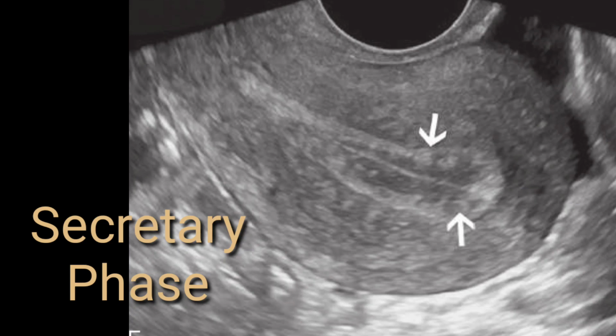So again, this endometrium is in secretory phase, and its thickness is nearly 15 to 16 mm. Many clinicians also suggest that secretory phase can be divided into two: early secretory phase and late secretory phase. Well, it's up to you if you are confident enough to mention early proliferative phase or late proliferative phase, this would be absolutely fine. But if you're just mentioning the proliferative phase or secretory phase straight away, that's again good.